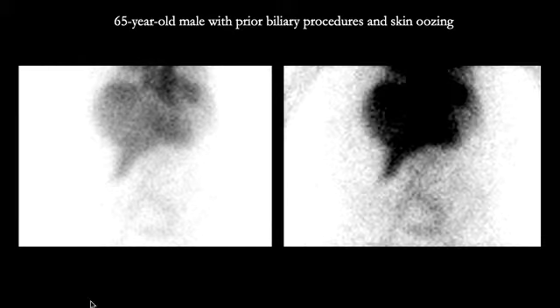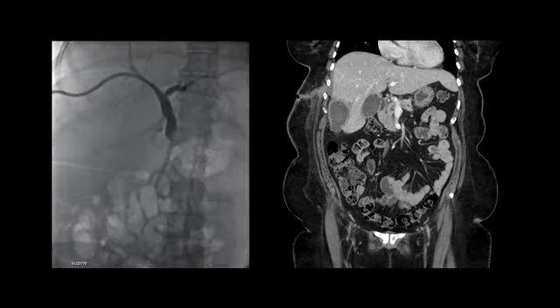So what's going on in this patient? Reviewing their prior imaging, we found two different studies. One of them is shown here on the left. This is a spot image from a fluoroscopic image from a cholangiogram performed through a percutaneous biliary drain, and we can see here is the catheter coming down from outside the patient through the abdominal wall, the liver, the CBD into the duodenum, and the contrast has been injected. We see opacification of left-sided and right-sided bile ducts, and part of the CBD, but the contrast does not extend down into the duodenum, and so this external internal biliary drain is not working.